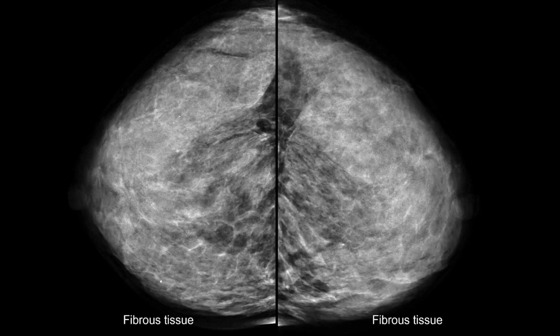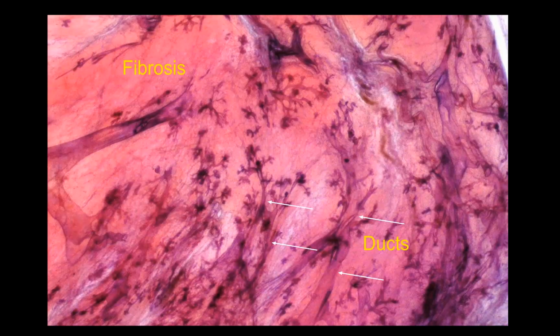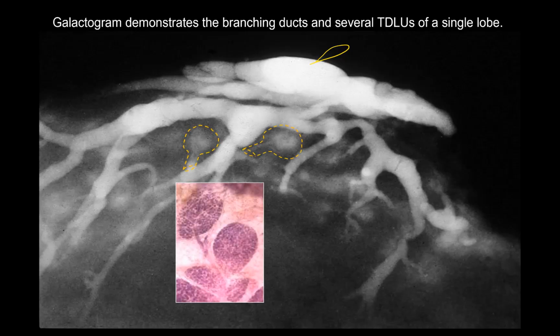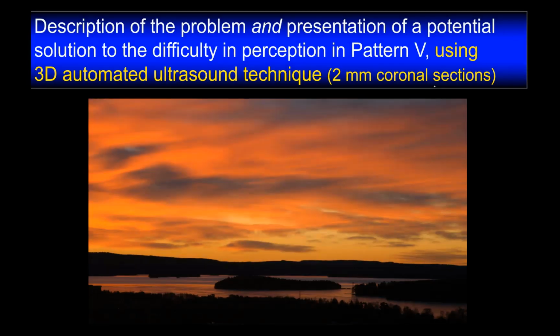Yeah, can be cancer. So now we are going to chase the contour, whether the contour is retracted, whether the contour is bulging out, whether there are calcifications and so on. Very difficult. Huge palpable tumors may be hidden in it, and huge palpable cysts may be hidden in it, like in this case. If and when she has nipple discharge, then we might be able to visualize them, but that's not fair because that happens very seldom. This is a problem. Let me show you the problem and let me give you a solution to a problem.